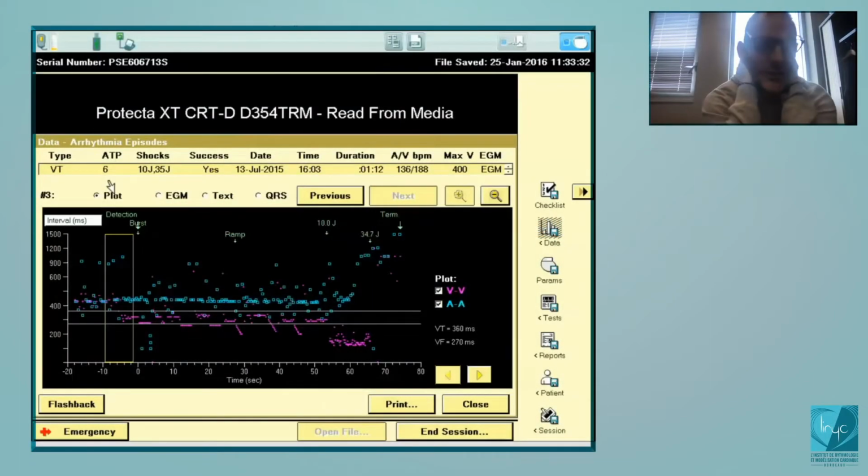So we're going to discuss today about problems of oversensing. Okay, Hugo Pierre, you're here. What do you think about this plot?